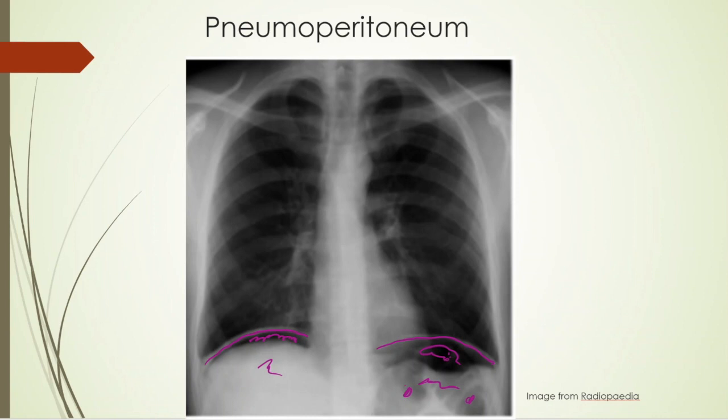And again, A for airway. Come down, here is the trachea where it bifurcates. There's a carina. Bones, go out and look at all the bones. Ribs look good. Clavicles look fine. Vertebrae look good. And then on to the cardiac silhouette, mediastinum. Cardiac silhouette looks good. Mediastinum looks pretty normal. Aortic arch. D for diaphragms is where we picked up the pneumoperitoneum.